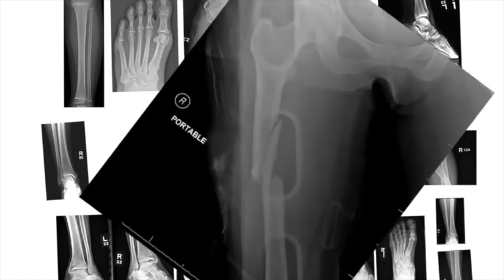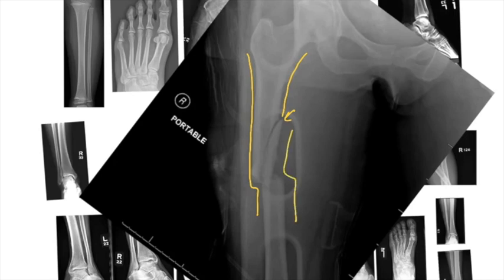Now here's a fracture that hopefully you won't miss. If you look to see if the border's smooth, clearly they're smooth here, smooth, smooth, smooth, not smooth, right? And there's a fracture. Smooth, smooth, smooth, not smooth. And there's a fracture. And this is clearly fractured, and the alignment is off. So you wouldn't miss this. Big fractures are very easy to pick up if you're looking for them.